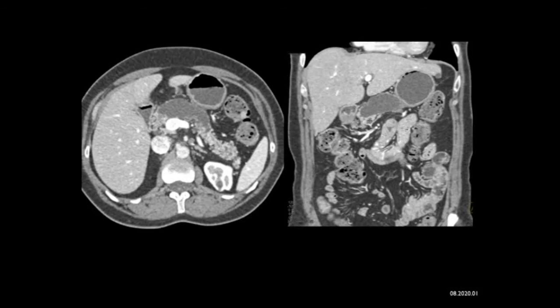So when you think about it that way and you look at the answers, it's not a pancreatic adenocarcinoma, but it could become one. I don't see a solid mass at this point. It's not a serous adenoma or a pseudocyst. Those could be cystic lesions, but this is a main duct IPMN. It's a little bit unusual in terms of appearance. Usually we see more pancreatic tissue around the duct. Often the ducts will be large throughout the gland, but not necessarily. And this is just a really good representation of a bit of an atypical case.